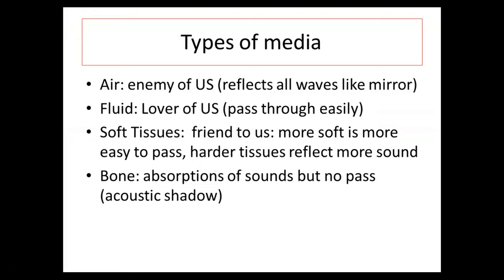And more soft tissues contain more blood, like muscles, and harder tissues contain less blood, like pleura, peritoneum, and pericardium. Bone. Ultrasound cannot penetrate bone, but the surface of the bone will appear like a crescent, and anything below the bone will be just a shadow.